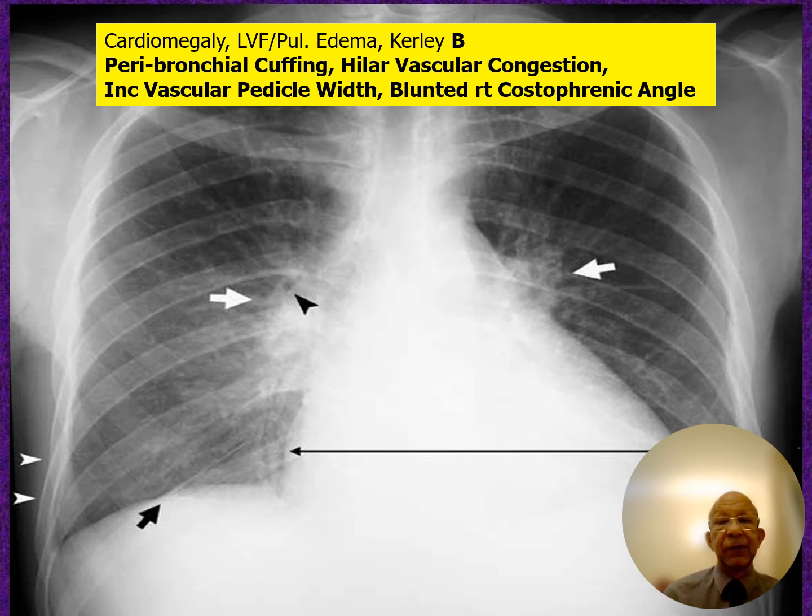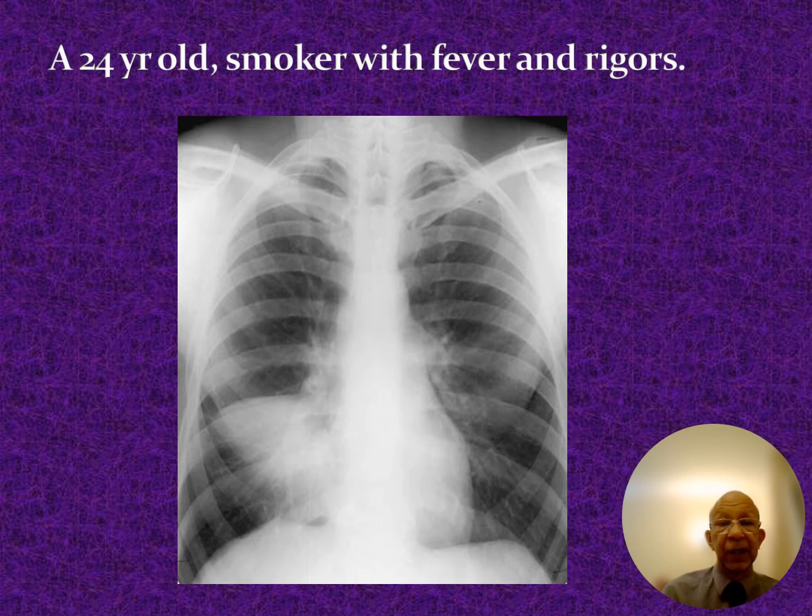Okay, right. There is another interesting finding here called peribronchial cuffing, which is again a sign of edema of the bronchial walls, right? And so it looks like part of the pulmonary edema picture, and the upper lobe cephalization or upper lobe venous diversion, right? Now, the rule that's broken here is that the right middle lobe silhouette sign is gone, and you have this triangular opacity there, right?